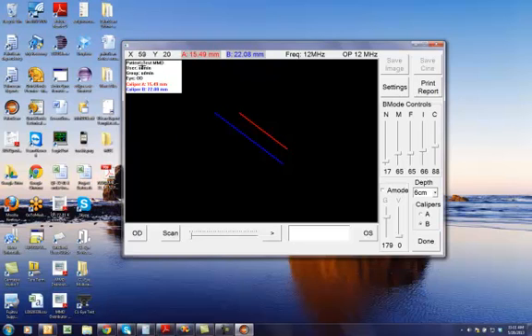And the patient information, the user, which could be the physician, or the group, which could be the hospital or the clinic name, they're all displayed here on the corner of the image, as well as the eye that has been selected. So if I switch on the OS, you will see that the OS, the eye type changes. Also, the caliper values are also displayed here in that corner as well.